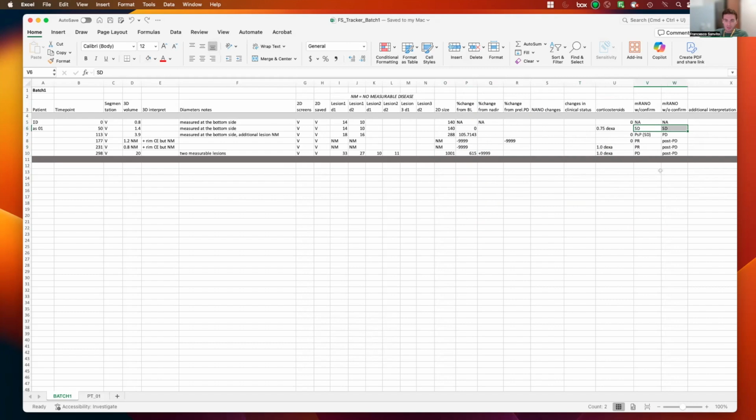So the lesion is stable according to RANO or mRANO, RANO 2.0 for contrast enhancing tumors with request for confirmation scan, which is essentially the same as mRANO. So it's stable disease for the second time point. It's PSP, which counts as stable disease, for the third time point because we saw that the lesion shrank back in the following time point. Then it hit a partial response, and then finally progression.